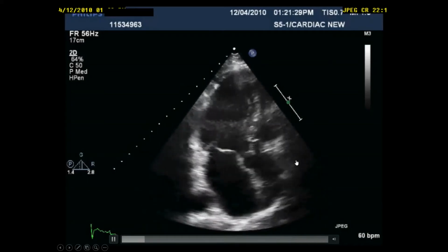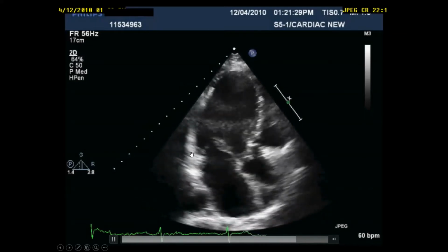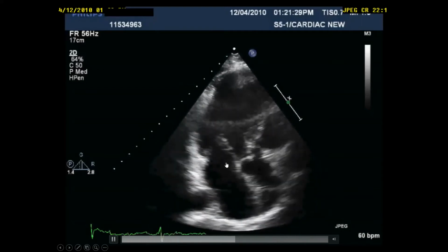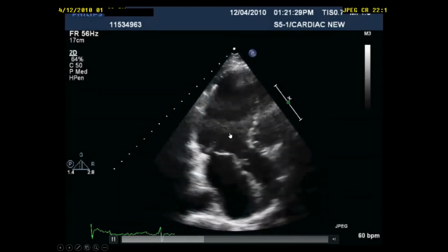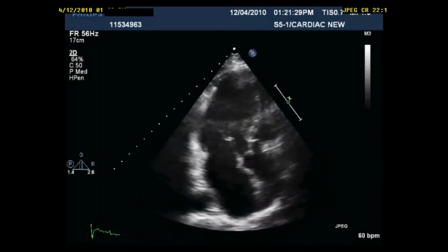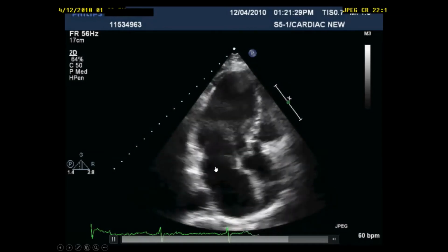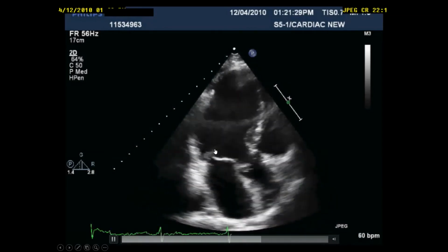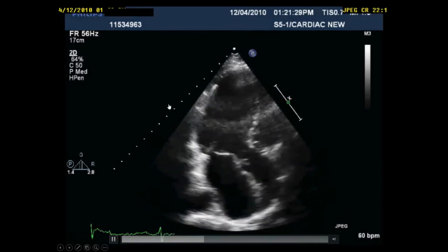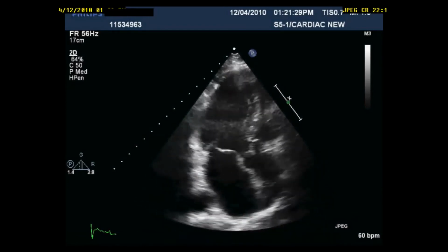So this is an infarcted posterior wall with tethering of the posterior leaflet, indicating ischemic MR, the quantity of which needs to be evaluated, because here I am not giving you any color to decide how severe. In this patient, it was severe mitral regurgitation. That's why you have to describe the anatomy of the mitral valve. If you miss the anatomy of the mitral valve and only describe the wall and the view, you lose one mark out of the total.